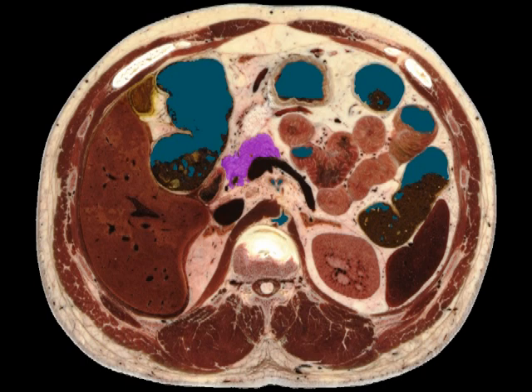In this final image, none of it is labeled. This is for you to practice on. The spleen, liver, kidney, head of the pancreas, inferior vena cava, diaphragm, splenic vein, and the portal vein can all clearly be seen. The head of the pancreas is colored purple. Please replay this video multiple times and correlate this with the CT scan video to better understand ultrasound of the pancreas.